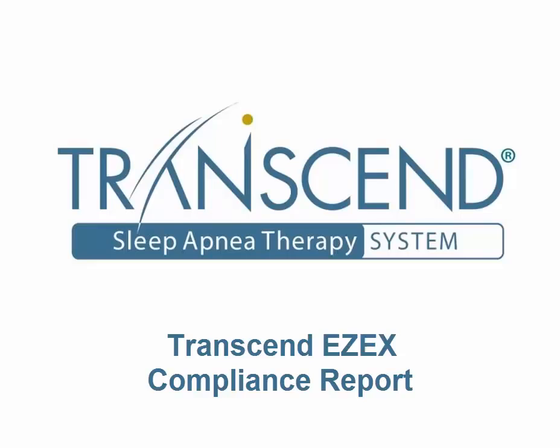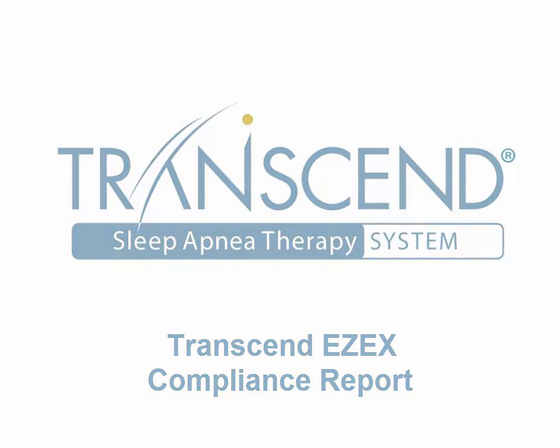The Compliance Report displays several sleep parameters used to define efficacy of therapy. In this video we will cover each parameter of the Compliance Report.